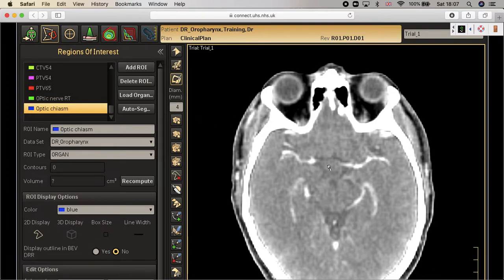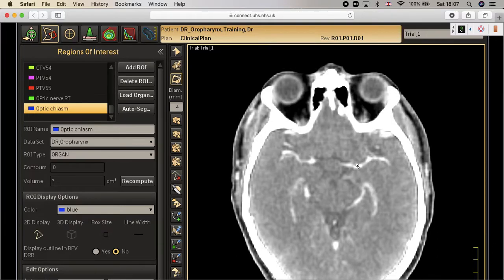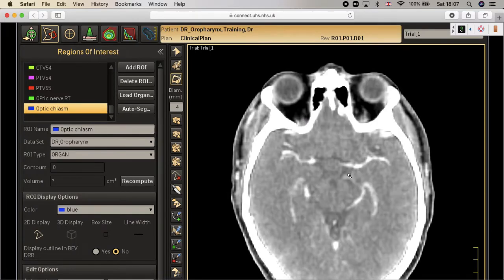But for those who are drawing it on the CT scan like me, without an MRI, you have to familiarize yourself with what we call the circle of Willis. And I just have to refer to my mentor here, Frank Lohr, who taught me this a long time ago, and I'm using it till now. And I think most of my colleagues are using it in our center now.